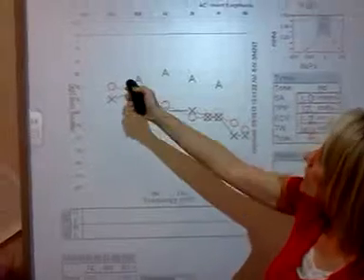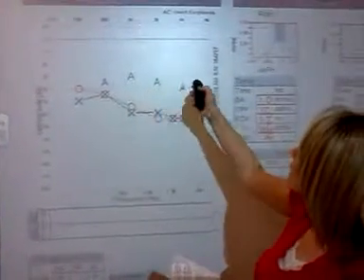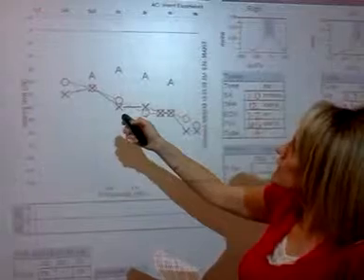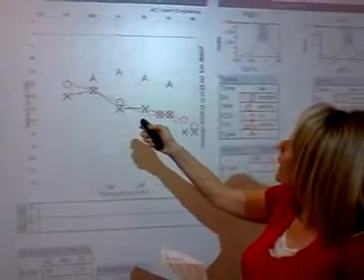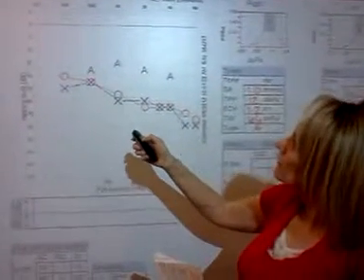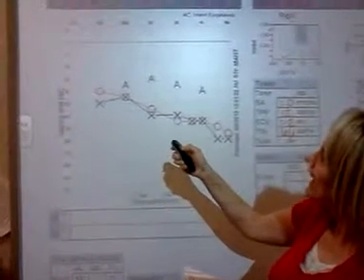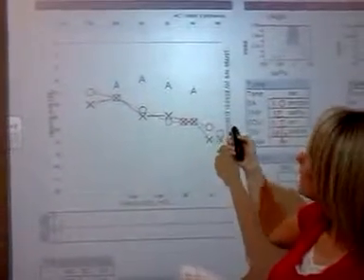Okay. Second on the audiogram, the horizontal axis is the pitch or frequency, and this is how high or how low a sound is. So the numbers range from 125 all the way to 8,000, and they are measured in hertz. So the number 125 down here on the left side of the audiogram is the lowest pitch sound a person can hear, and each line to the right of this is a higher pitch sound.